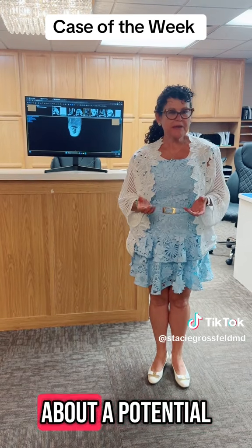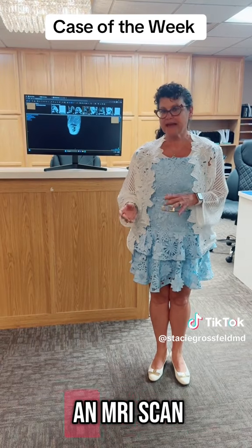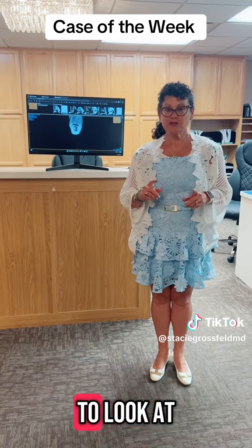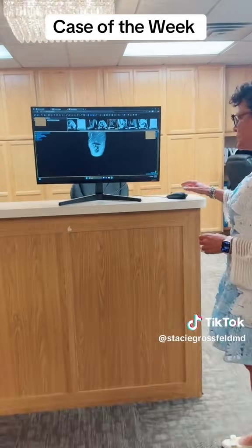I was concerned about a potential lateral meniscal tear. So I went ahead and obtained an MRI scan of the knee. I want you to look at it and tell me what your differential is when you look at these images.